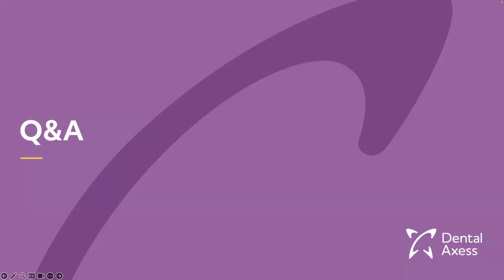I can review all the notes. I always like to do this. I review the modification, but I also go and review the first request to see if there is something that I'm missing there. I can take a look at the photos if that is needed and if I have them. And make the modification based on your request, on what you need changed for this patient.